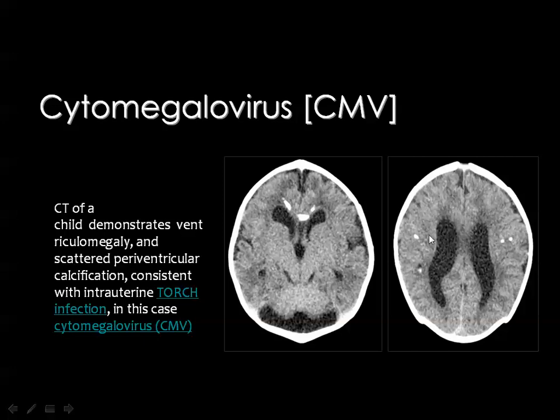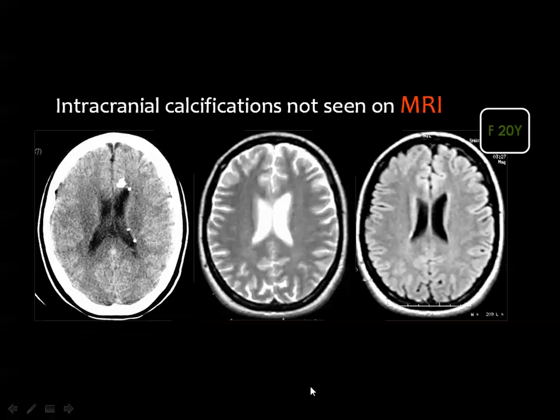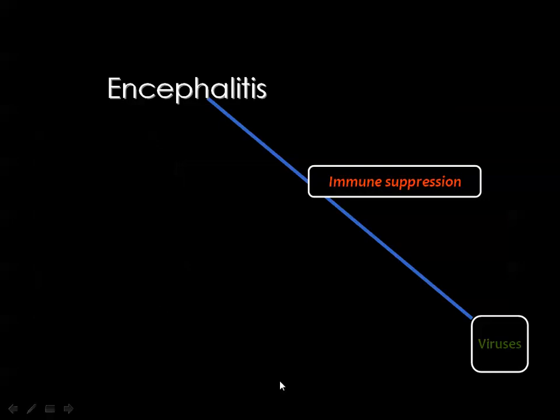of the genu of the corpus callosum and also in both cerebral hemispheres. In this case, the calcium is not intimately related to the wall of the ventricle. Once more, you should know that calcium, which appears clearly in the CT images, may not be seen at all on MRI. And you can see here foci of subependymal calcification along the ventricular wall, which are not seen in this T2 weighted image or the FLAIR weighted image.